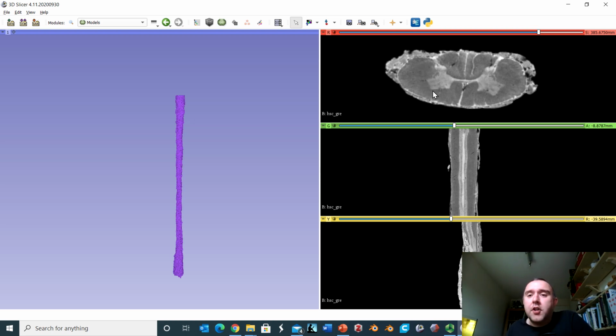that we've got lots and lots of white matter. All right, we've got lots of white matter because, of course, at the top of the cord, the motor tracts have barely yet distributed their fibres along the length of the cord to the body. And furthermore, at the top of the cord in the cervical region, all of the sensory pathways have converged together and are now all making their way up to the brain. So we've got lots of white matter here, and we can see that the grey matter, particularly the ventral horns, are very, very large.